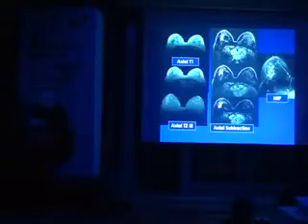So what's the differential diagnosis when you see clumped enhancement like that, non-mass enhancement? We spoke about the foci and then the mass, and you often hear the term non-mass enhancement, meaning enhancement without borders, ill-defined, and we call it non-mass enhancement. As in this case, the clumped foci enhancement, non-mass enhancement.